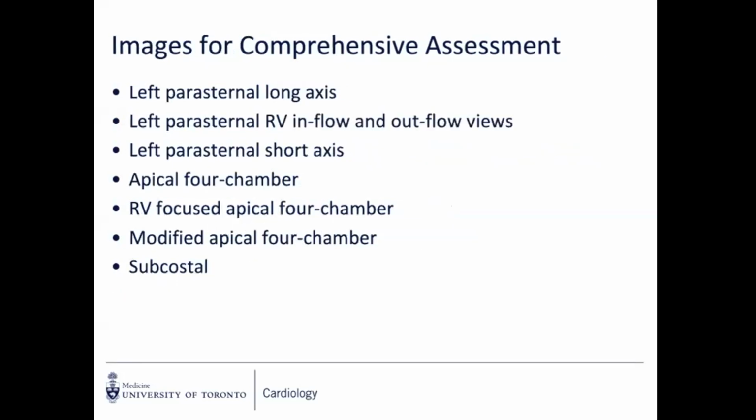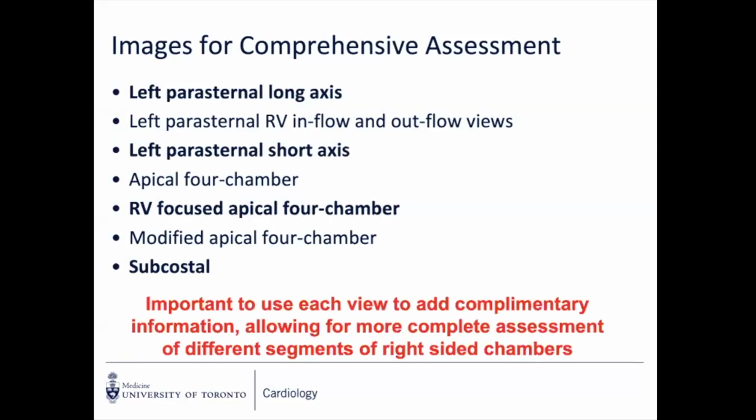And in terms of the images for a comprehensive assessment, everybody's already familiar with this, but it's essentially our standard protocol. So left parasternal long axis, or inflow and outflow views, or short axis, apical four-chamber, and then the RV focused apical four-chamber, modified apical four-chamber, and subcostal images. And for the purposes of this talk, we'll be focusing on these four.